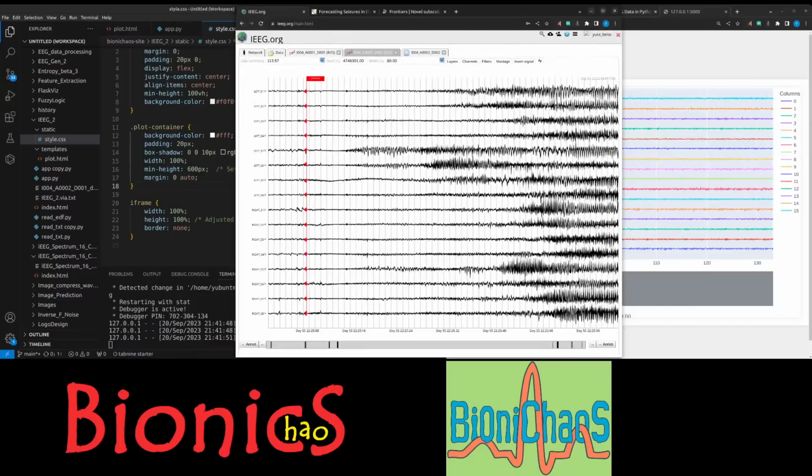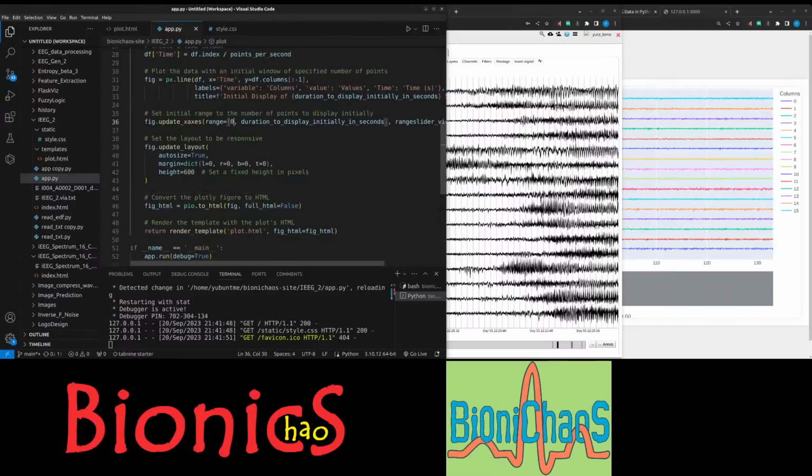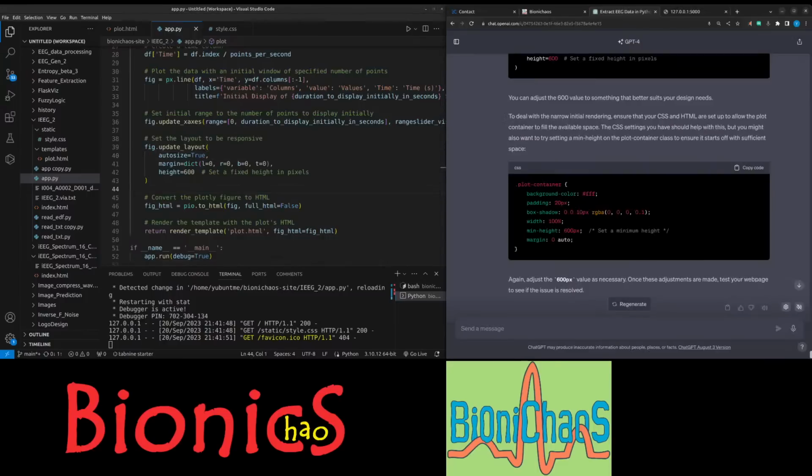so I want to load it from this second. It's probably this range from 0 to whatever. In Python script, how to change so that the start time is not 0 when loading the page.